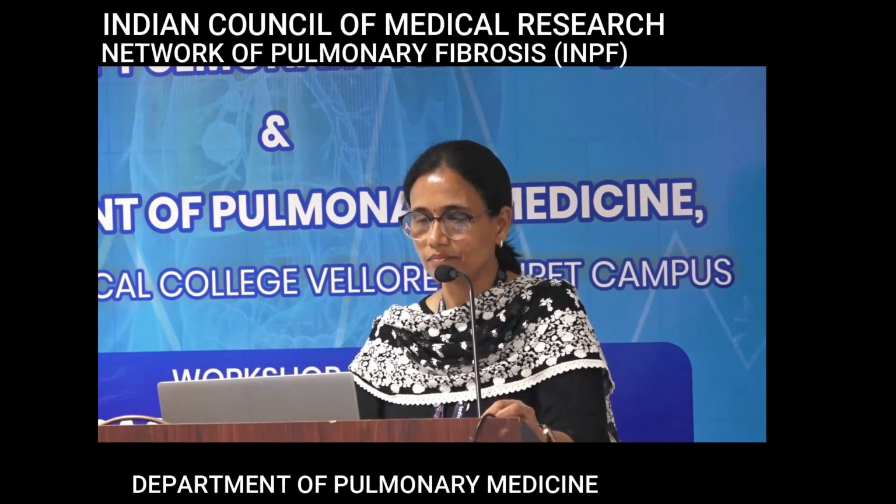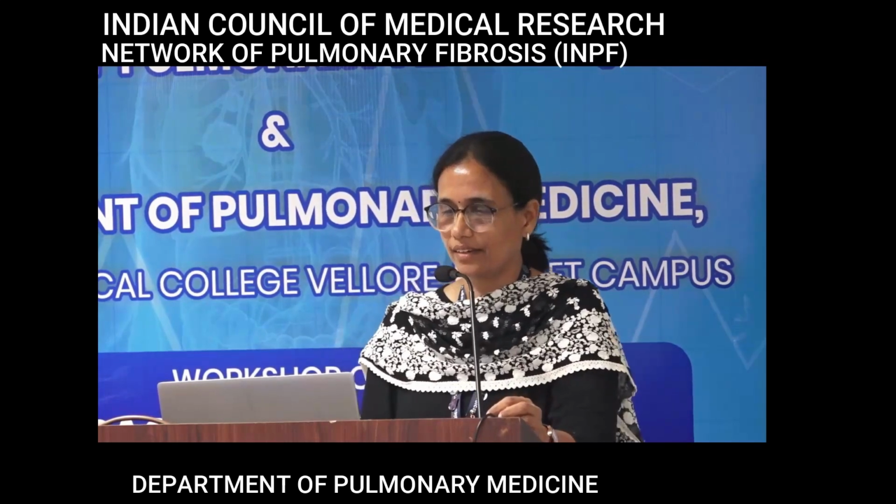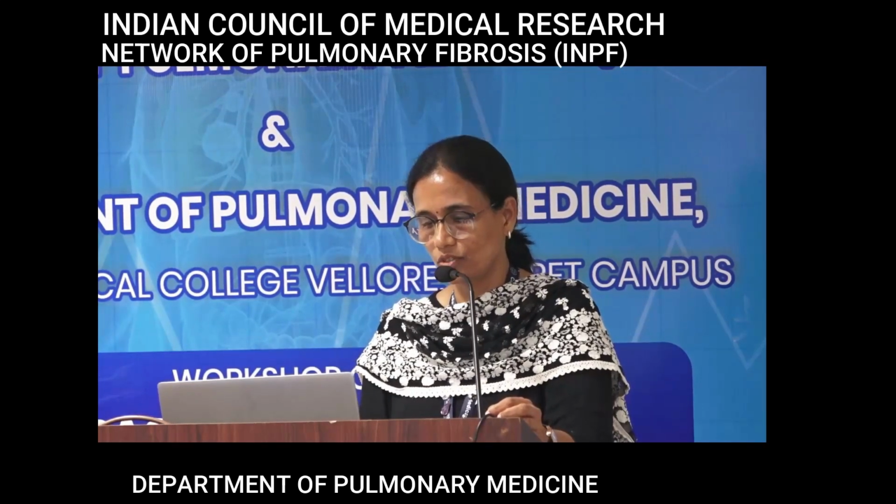Okay, next case. So what do we see here? Let me describe. So basically, what is all this?